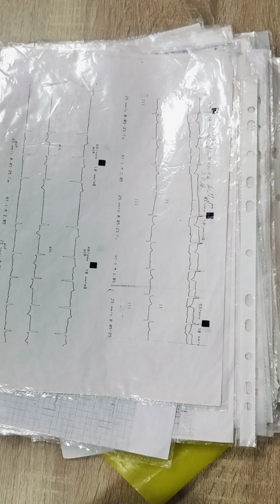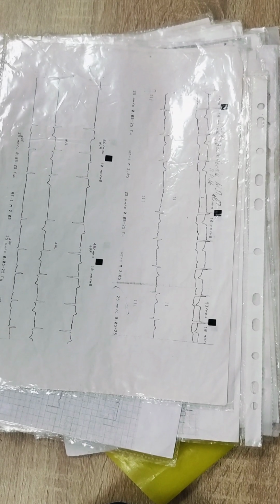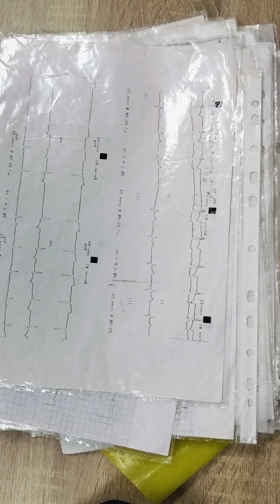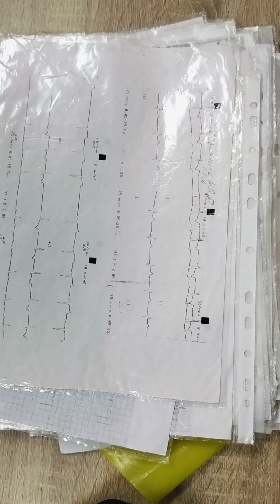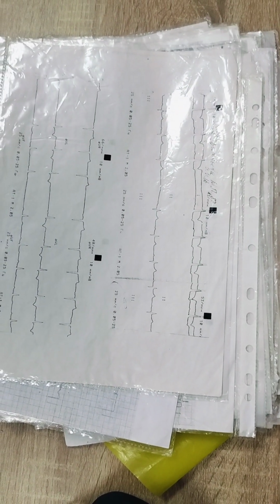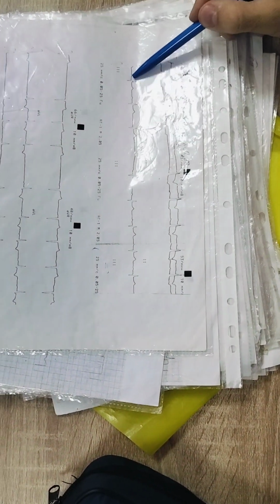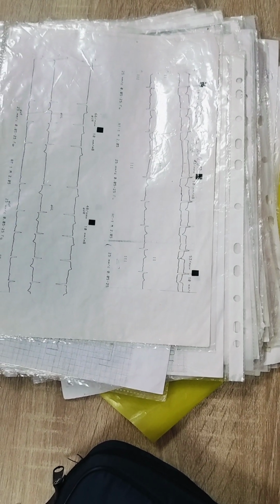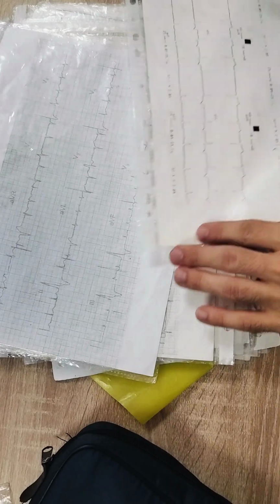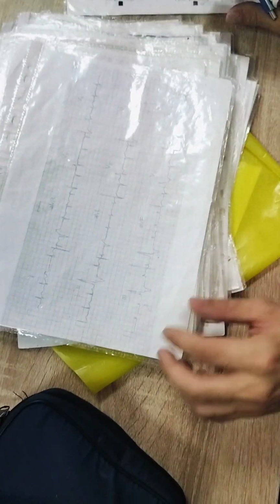Acute phase is necrosis plus ischemia. Ischemia is ST and T. Necrosis is Q wave. Subacute stage is only negative T plus Q wave. In our case, there is only Q wave. Look at the blackboard. Fourth stage, macrofocal myocardial infarction. So, same picture. That's why it is previous myocardial infarction. It is post-infarction cardiosclerosis. And arrhythmia is sinus one because P waves are present everywhere. This cardiogram is complex enough.